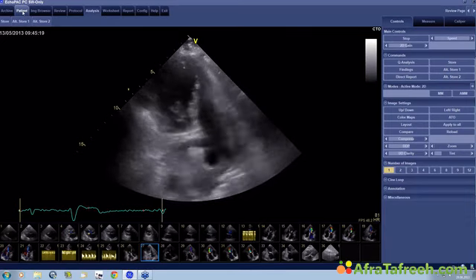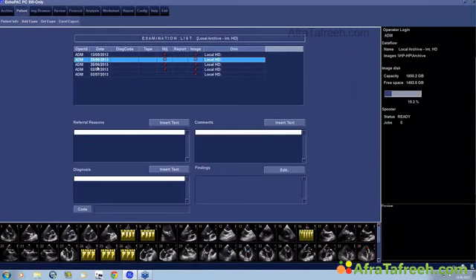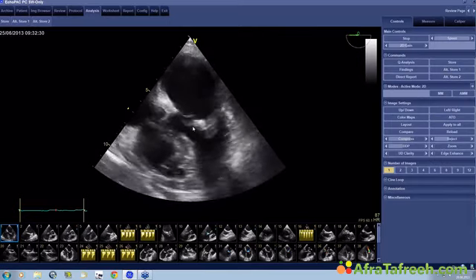That was the plan. And just a few weeks later, we then actually performed the procedure. And we do this procedure usually with just transthoracic echo as a monitoring device.